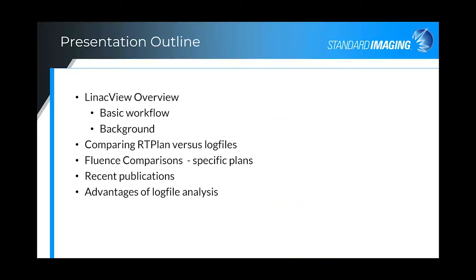So during my presentation, I will begin with an overview of the basic workflow, a quick look at the software, and then provide a bit of background on log files and how and why they are useful for patient-specific plan comparisons, where we compare the RTPlan and the log file.